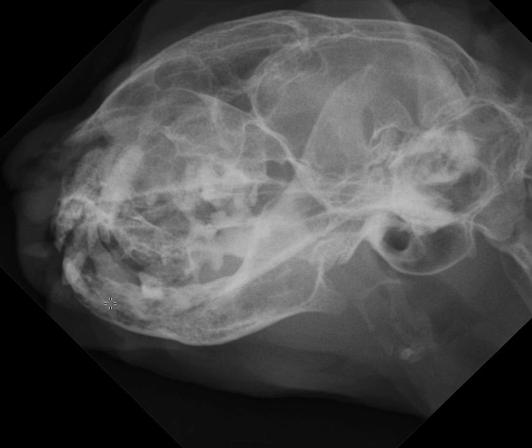I would say that I have the general impression that there is some lucency down here, but I don't think I could say anything more than that. And certainly there is some dental disease and even some absent teeth in this arcade.